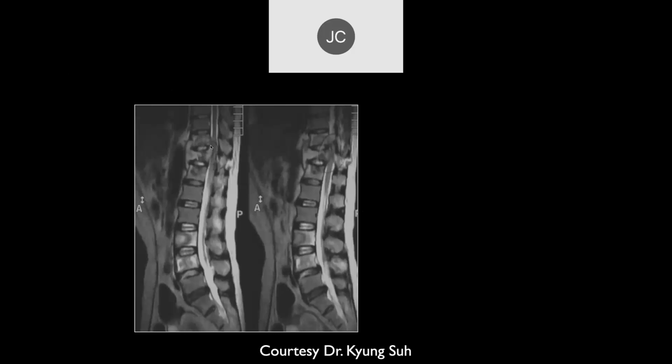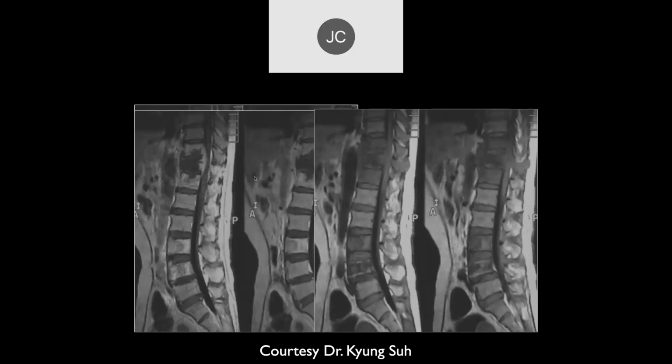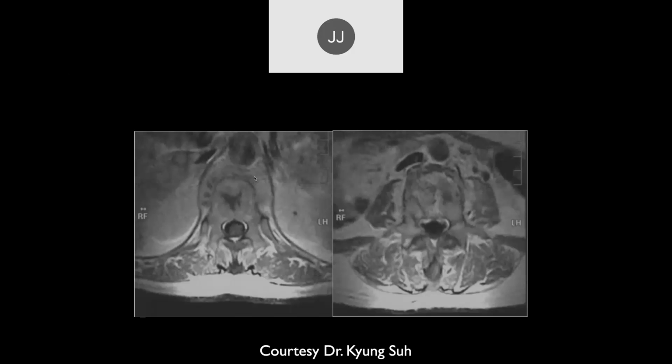And we can see there's severe central stenosis. But here we've got, as you said, skip lesions. And what do skip lesions in the spine make me think about in terms of infection? I would like to get a chest X-ray in this patient. Yeah, I would think TB, right? Yep, this is very characteristic. Well, both of you passed.